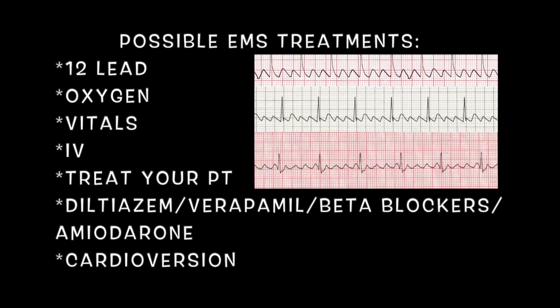Just so you see in this picture, I included a few different conduction rates. So we have our 2-to-1, 3-to-1, and 4-to-1 conduction rate, just so you guys can see it.